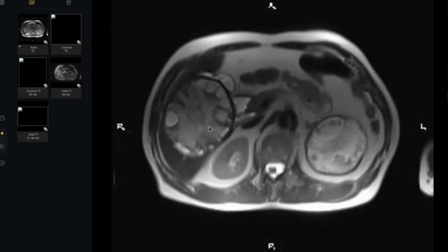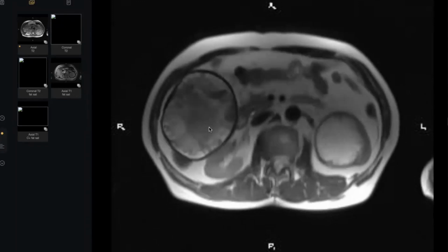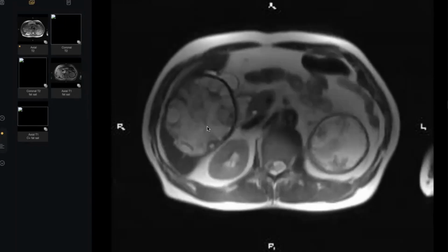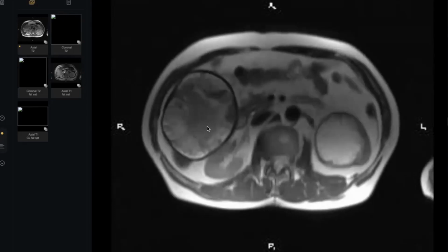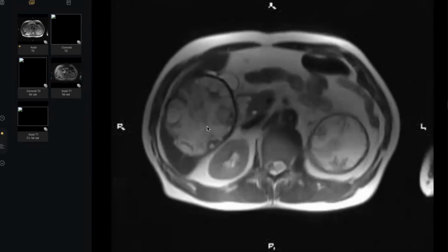What is the name of this appearance? Sir, I'm concerned about this as a hydatid cyst, showing multiple cysts. What is the name of this appearance? Something like water lily sign. Not water lily. Something else. Bunch of grapes or honeycomb sort. Yes, but there is another common name. Daughter cyst. Yes, okay. Go on. What else?